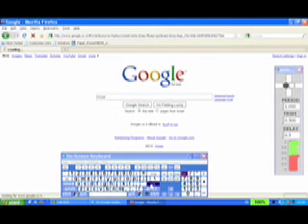Rightward motion selected, stopped. Downward selected, stopped, and enter selected, providing us with a search for the word nose. Leftward motion selected until the cursor entered the actual page, stopped.